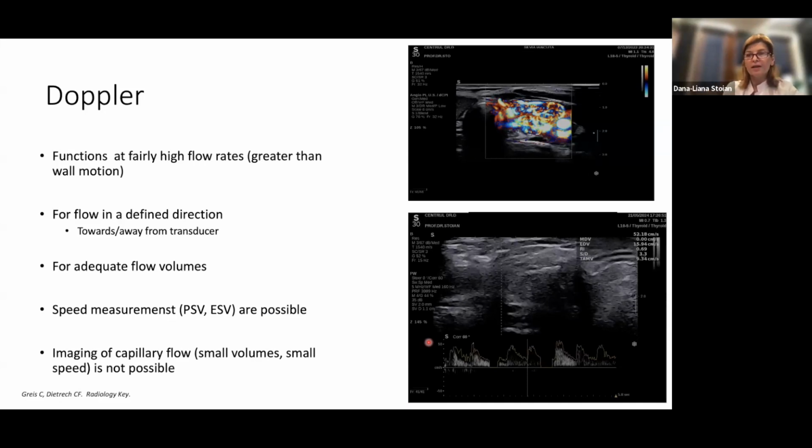Of course, you can say Doppler is useful in the typical diagnostic of Graves' disease, and it is clear that you can use conventional Doppler for seeing high flow rates. You can see even if we have flow onwards or towards the transducer, but actually it's not important. In this example, you might say, okay, high increased vascularization, and in such a case, you are expecting a hyperproduction.